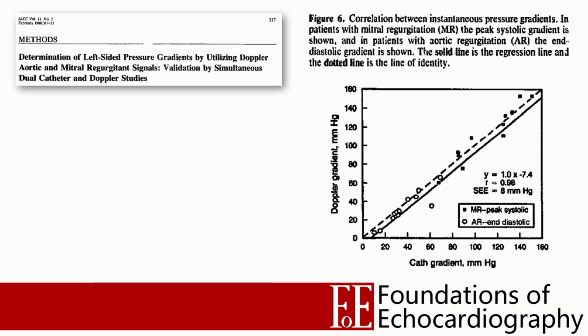Assuming there is no stenosis of the aortic valve or outflow tract, then we know that the LV pressure will approximate the systemic systolic blood pressure, which we could measure with a simple blood pressure cuff. It's tempting to imagine that if we know the peak velocity of the MR, then we could apply the simplified Bernoulli equation to this measurement to obtain the pressure gradient, and then subtract the pressure difference from the systolic BP to obtain the left atrial pressure. However, while some investigators have shown good correlation between MR Vmax and invasively measured pressures, there are some limitations that prevent this technique from being recommended.